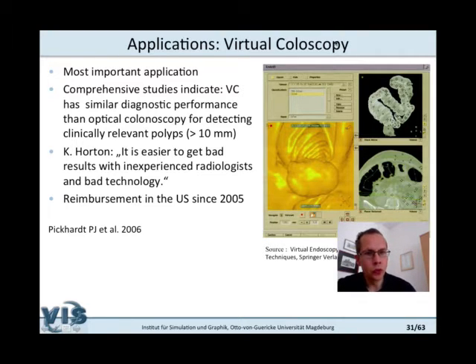You see the endoscopic view again with some lighting effects. You see an external 3D view, and you see the slices, and you also see the path that was computed so that this becomes visible as well. So this combined visualization often is very useful.